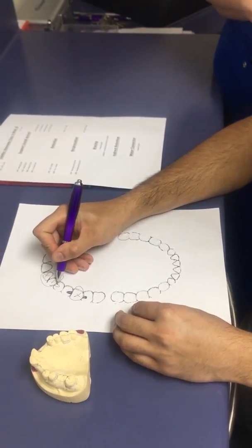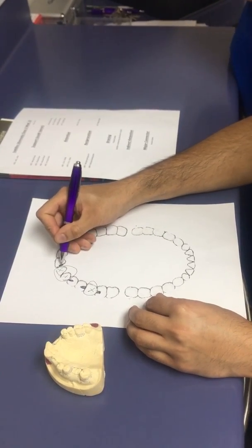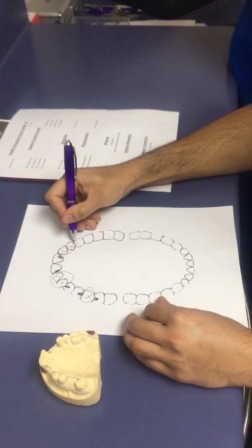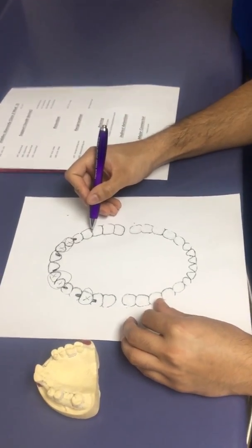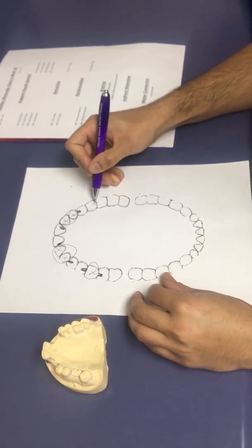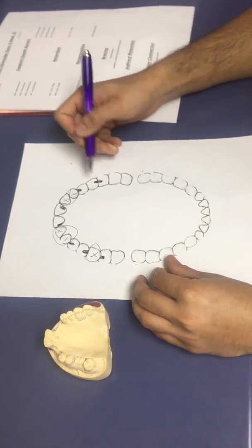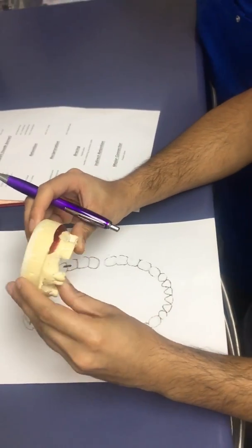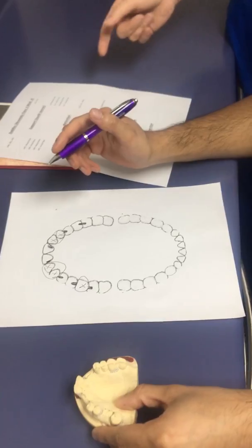Okay, that's good. Put one rest seat here. Some rest seats here, singular rest seats on the ones, and then either side of the abutment teeth. And then I think I'm going to put some rest seats here. What's the rationale behind putting rest seats there? Because we didn't want to put them too anteriorly, because then they might be in the smile line and it wouldn't be aesthetic for a patient, especially if they're a young patient and they have a high smile line. Okay. Alright, so what's the next step?